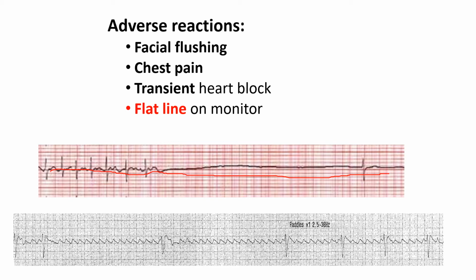On the top one you have the asystole; on the bottom one you might have that asystole and then it comes back in the underlying rhythm, which, if you look here, is an atrial flutter, and then the patient will probably go back into that rapid atrial flutter. So these are just examples of what you might see after you've given the adenosine: the asystole break, and then the rhythm will come back, hopefully normal sinus rhythm. Or it diagnoses that they're in A-fib or a flutter, and then you start them on a beta blocker or a calcium channel blocker.